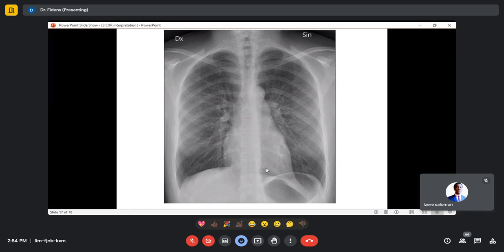I wanted to see whether you have understood what you said. The reason for checking the technical qualities of an X-ray is to tell yourself whether you can analyze this image or not. Out of 100 images, very few will be 100% good in terms of the 5 qualities you have seen.